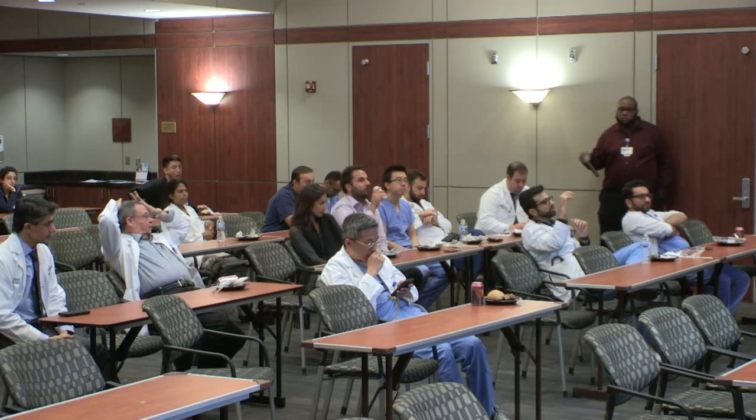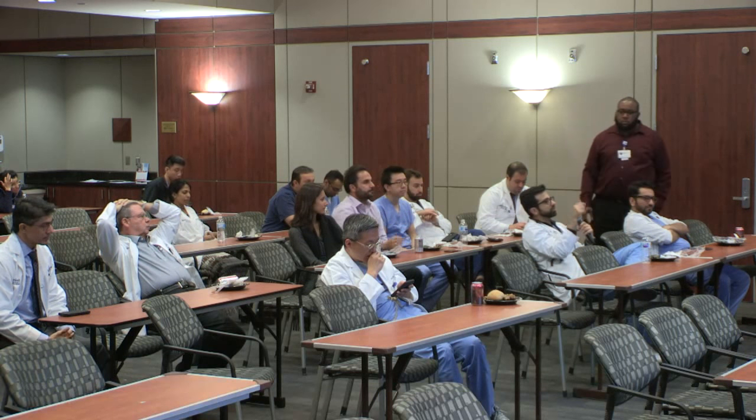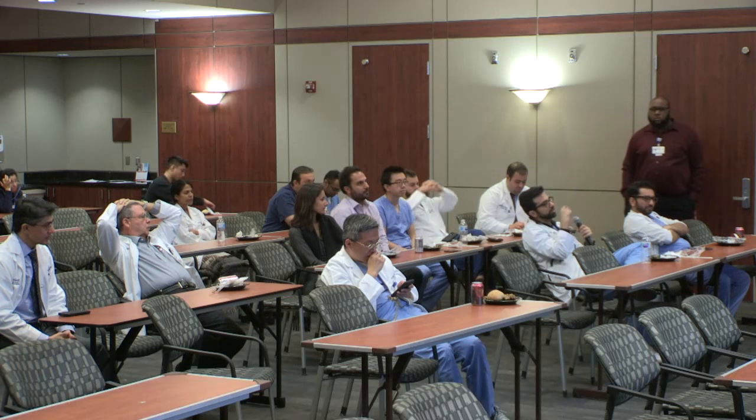Why is it that the atrial reversal duration changes as opposed to the A duration? What does it mean when you take the atrial reversal minus A?